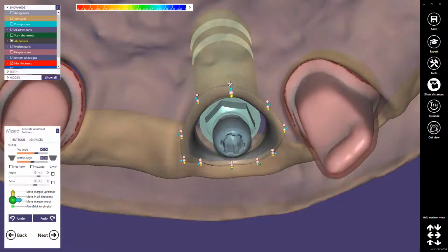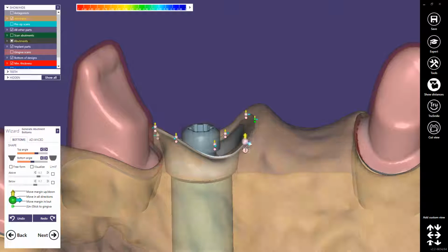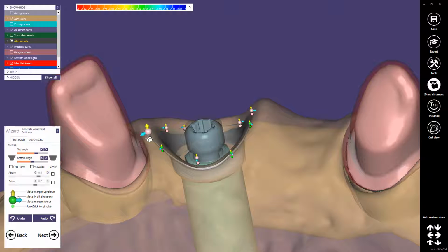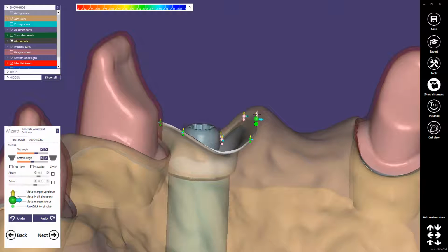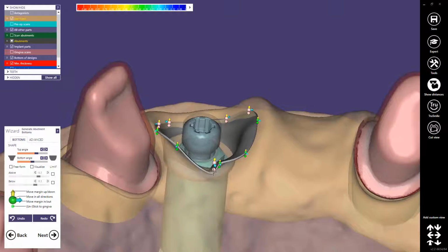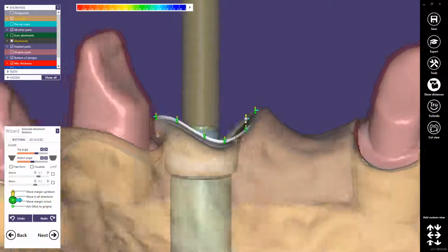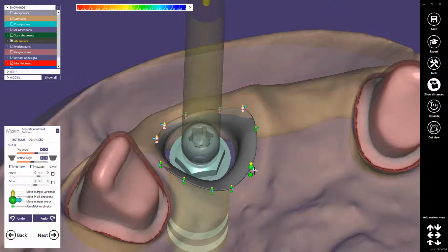great. And then on the lingual side I usually go a little bit higher than the emergence profile border, because on telescopic crowns we also create a kind of border which is a little bit higher, and then we can create this border here already with the emergence profile. Can do that like this.